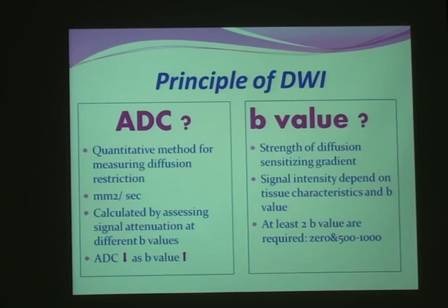So, we cannot rely on something subjective or qualitative. We have to have a value for that, for not everything that has restricted diffusion expresses too much cellular packing for malignant tumor. So, the ADC is just somehow the subtraction of the diffusion images, and it reflects how much there is restricted diffusion within these areas.